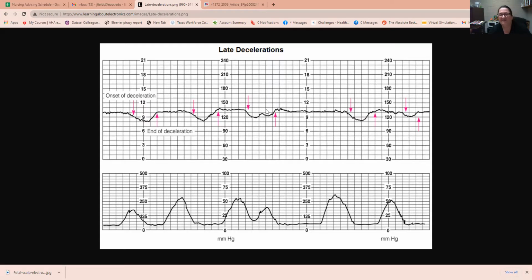We've got, this might be minimal. I think this is minimal. We've got a little bit here and there. We do have an accel here and there. It looks almost like a little bit of shouldering, but this is one we're going to be watching closer.